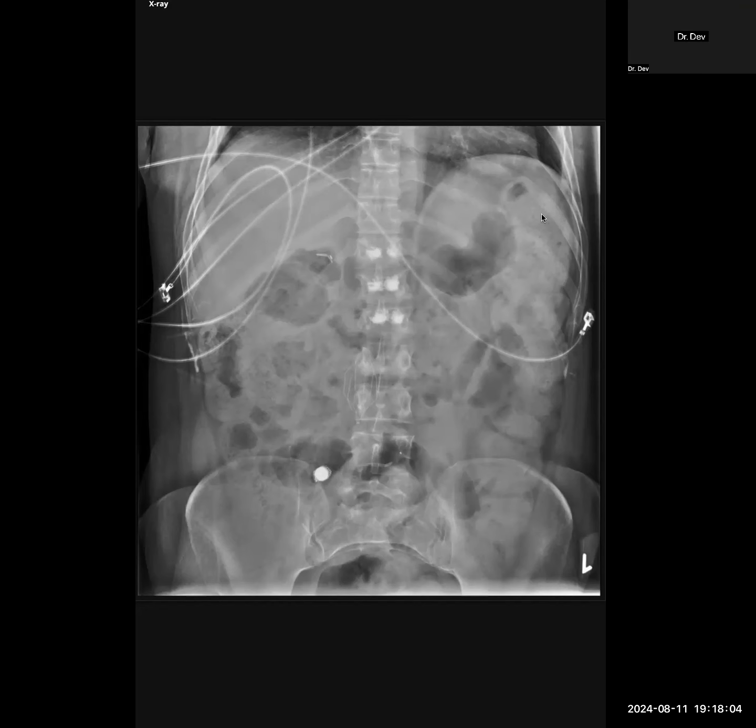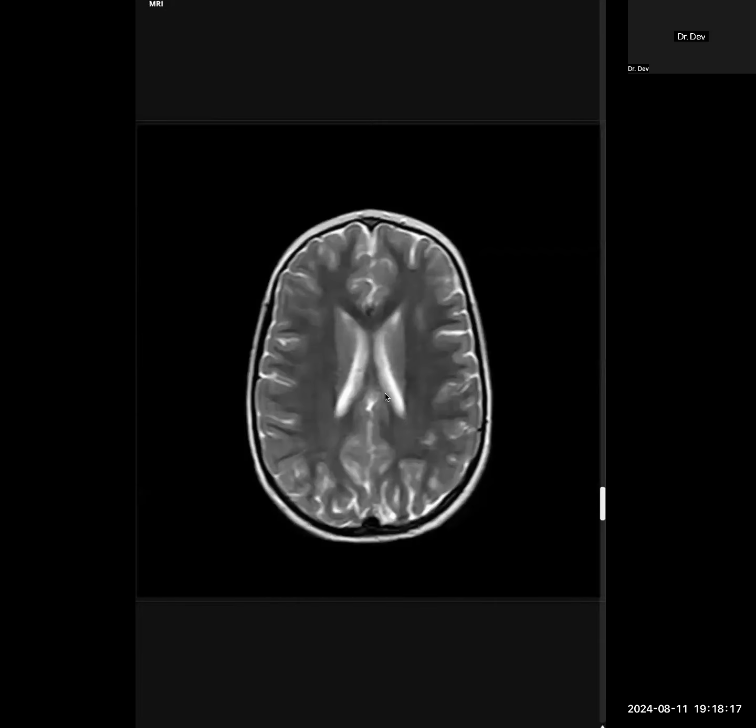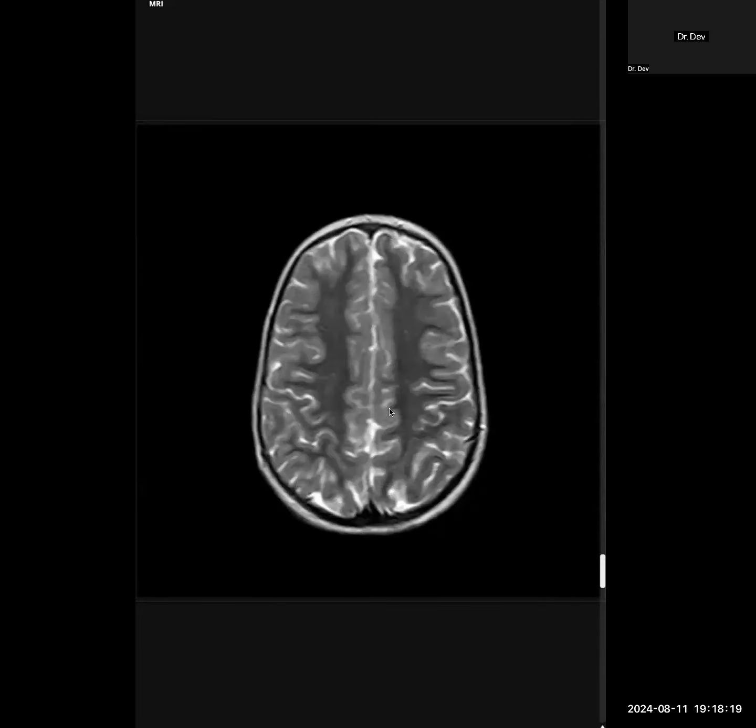What will you do? I would inform this finding immediately to the surgical team, the referring clinician. I would further recommend a CT abdomen for further evaluation. Okay, next one. If you ask for control, you'll get it.